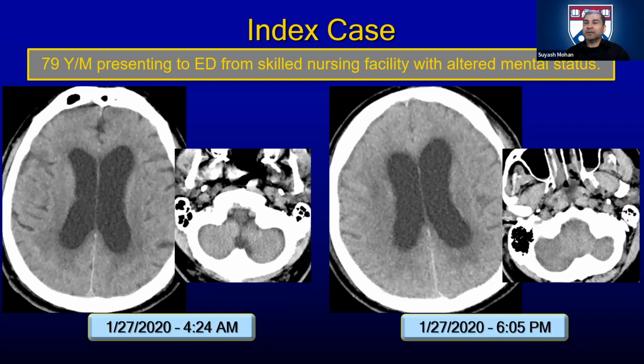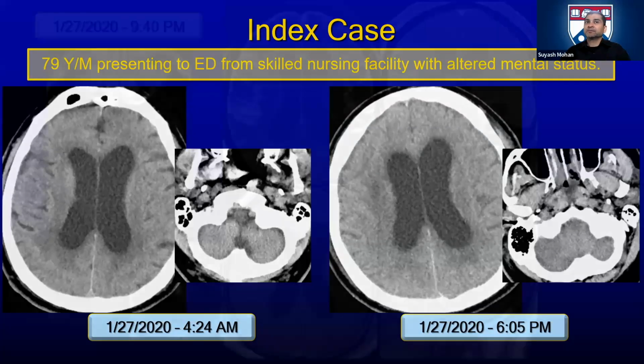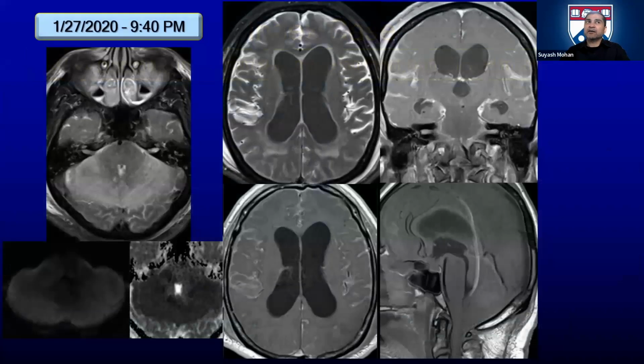And they glanced at the imaging finding. They said, no real change. Basically, the same report was given again. Now, this is the scan a few hours later. The patient kept on deteriorating. Now they are posturing.